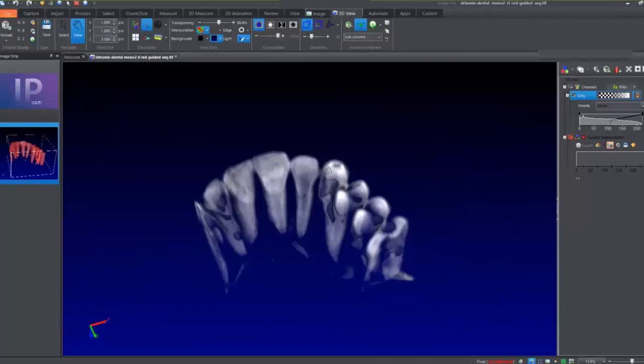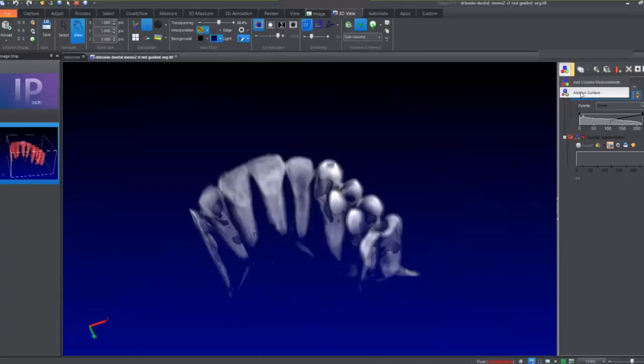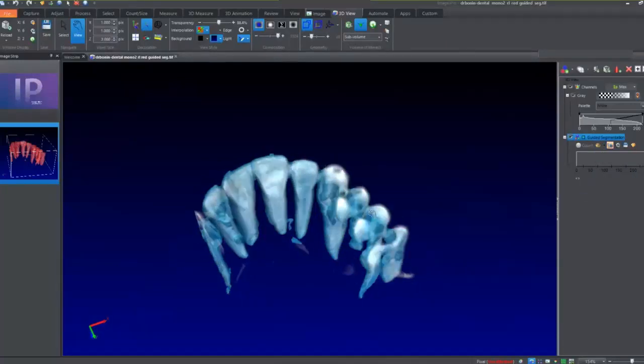Now, once you have your raw data here and you want to do some further quantification, then we can use these tools over here on the display bar, and we could add an ISO surface, let's say. So here's an ISO surface that can be applied here, and the colors, obviously there are different preferences, colors can be applied, and then the ranges for the segmentation can be applied, and then you can do a count, okay?